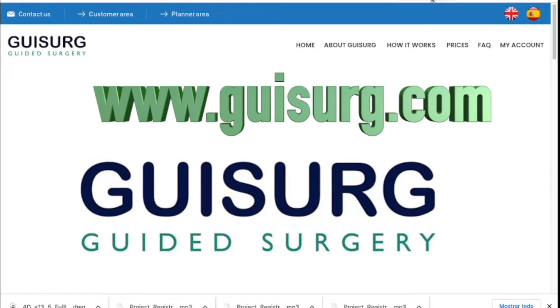First of all, we will open www.guisurg.com in our browser. Once on the main page, we will access the Customer area. This area can be accessed by clicking on Customer area in the upper blue bar, or through the My Account area menu.